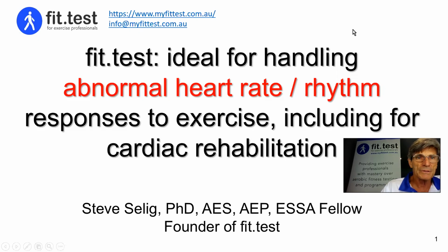I'm just going to show you in this video how easy it is to use fittest with low heart rates or even heart arrhythmias, both to estimate fitness and to prescribe exercise based on whatever criteria you pick. Generally speaking, though, with low heart rates I tend to steer away from prescribing exercise based on heart rate, because it creates a lot of inaccuracies and a lot of practical difficulties for the client in trying to manage their exercise intensities against a series of low heart rates.